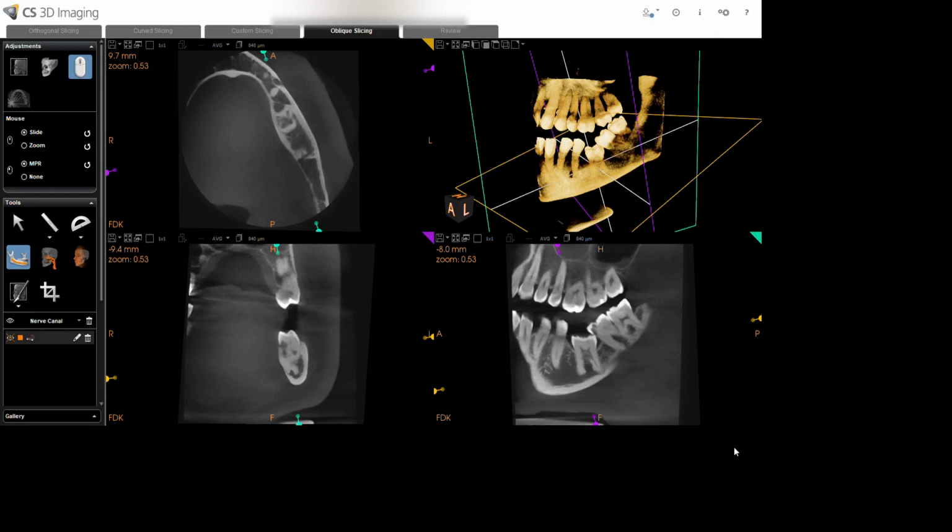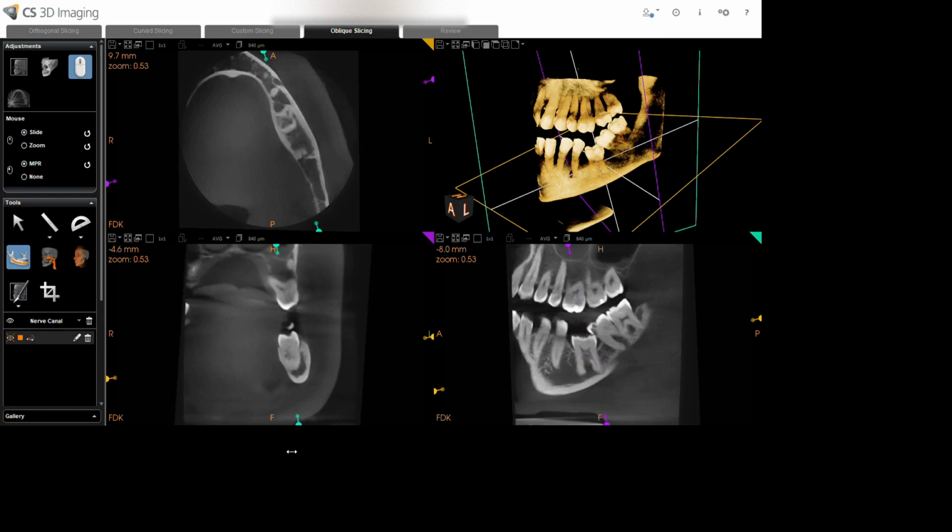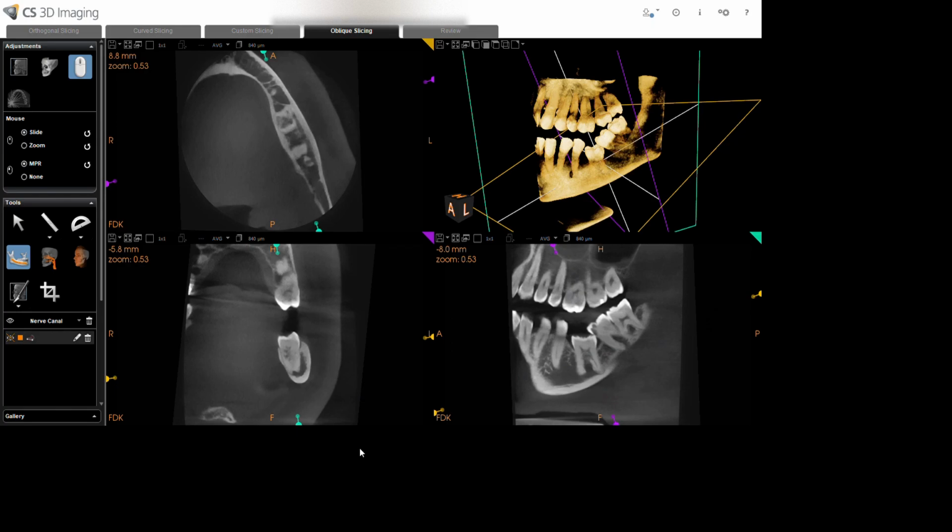Now if we talk about the roots, even if you see both the roots in detail, first we see the mesial root. So what is happening, this resorption is involving nearly the coronal third of the mesial root here and here, both the buccal and the lingual aspect, as well as the distal root. If we see here also, the resorption is involving the coronal third of the root.